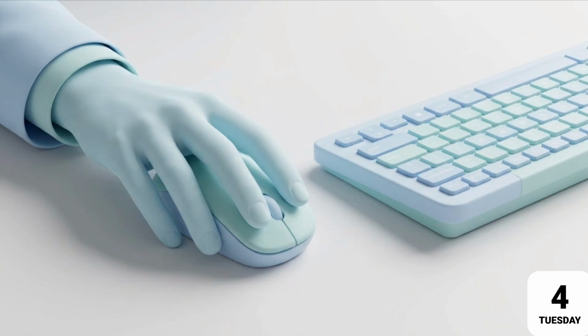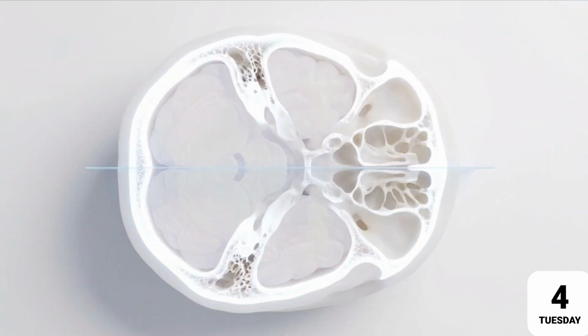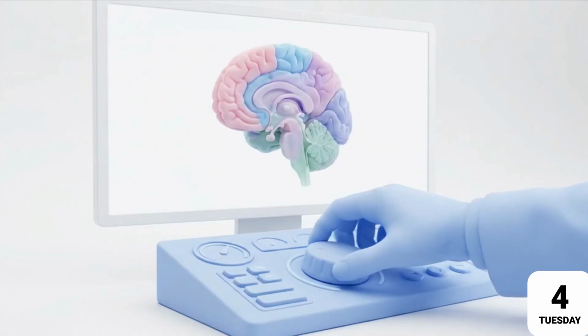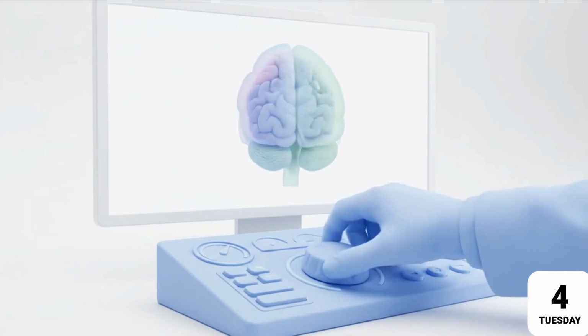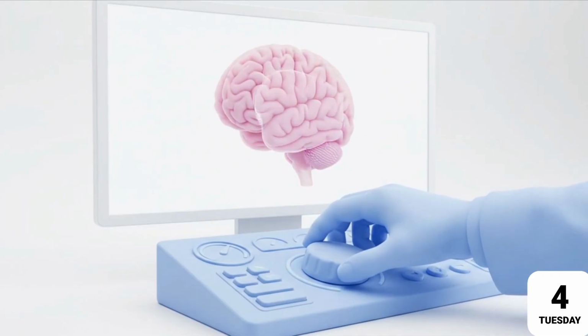ER teams actively adjust this software to hunt for different problems. They select a brain window to view soft tissue, switch to a bone window to expose microfractures in the skull, and use a blood window to isolate active bleeding. A CT scan is a flexible dataset. Radiologists have to actively interrogate that data, manipulating the contrast to uncover the pathology hiding inside.